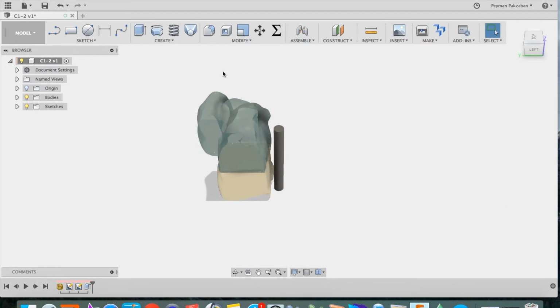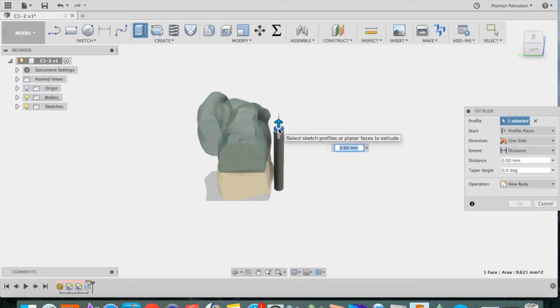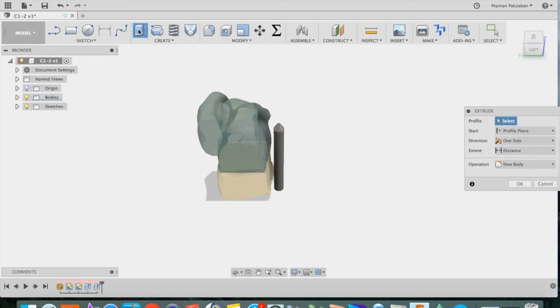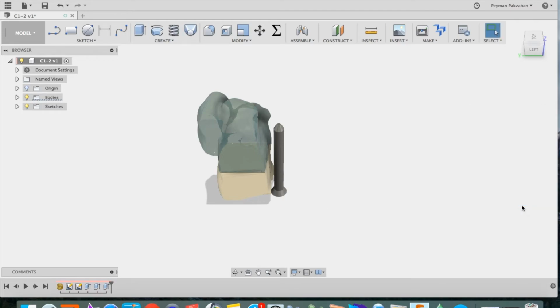And then we want to create a leading point for it, so we just extrude that further 2 millimeters and extrusion angle of -30 to make it pointy, and do the opposite on the back end to create a screw head, 2 millimeters and +30 taper angle.